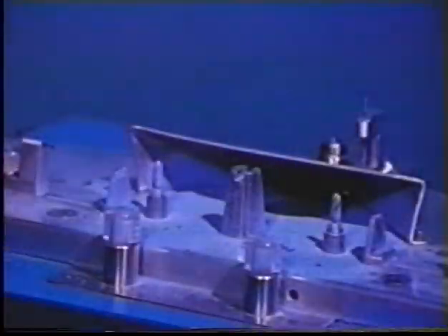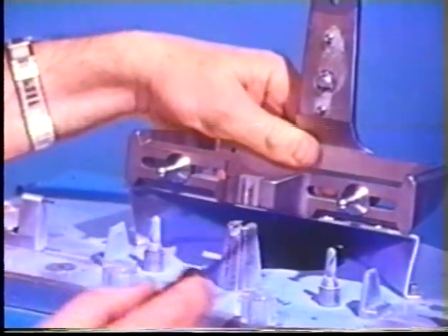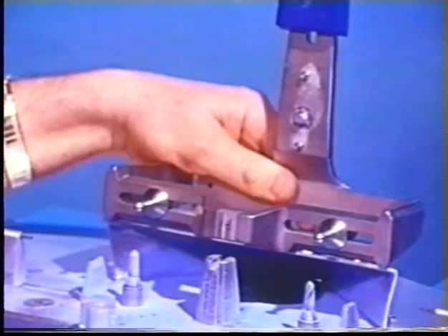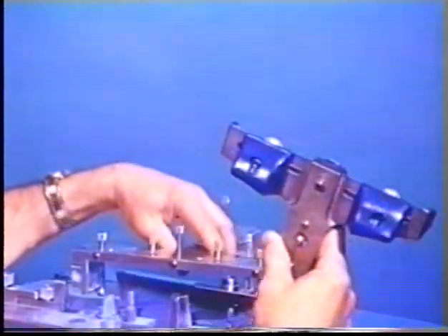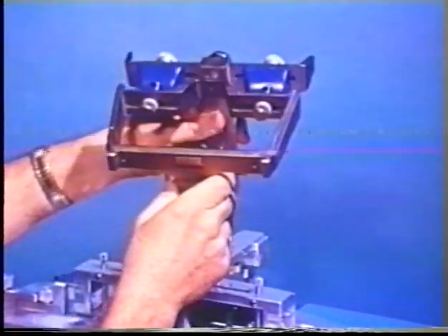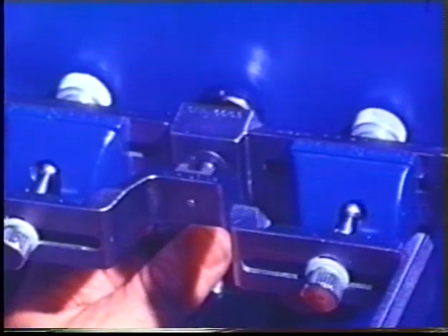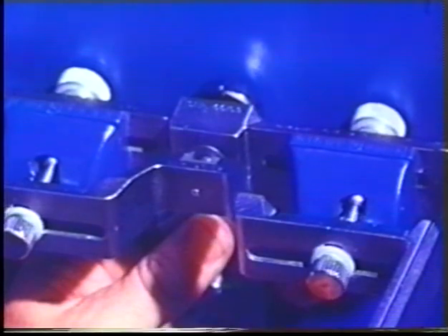This view shows that the condylar elements of the articulator and centric indicating key are spaced exactly like their counterparts on the reconverter. The analogs are removed and attached directly to the maxillary frame of the articulator for replay. Observe the right condylar element as it moves from centric to protrusion and back to centric.